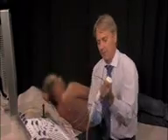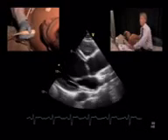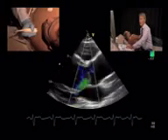Let's take a look at the severity of aortic regurgitation in this patient. We'll start with the parasternal long axis view. So this is the jet. And the first thing we notice right away is that the jet is asymmetric. It is directed towards the anterior mitral valve leaflet.